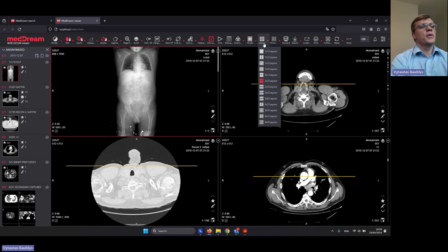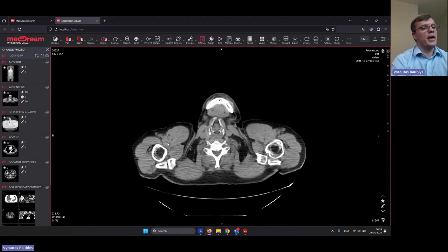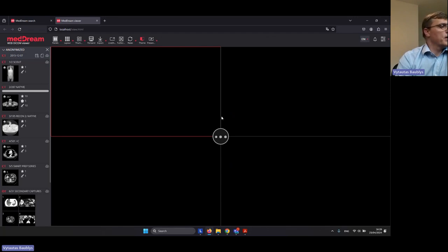Later on, Arturas will also show you another brilliant feature, how the MPR could load automatically without interactions, but I will show you this way because I didn't configure the hanging protocol for that yet. So how does this MPR look on my screen.